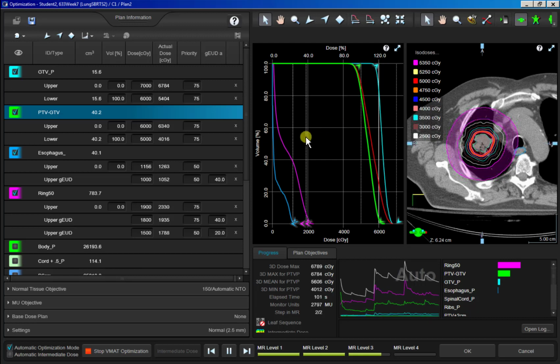Okay, so again, it just depends on the case. If you're not near any of your OARs like this, focus on that quick fall off, conformality. If you are next to OARs, failing objectives, overlapping with OARs, stuff like that, then you're going to treat that and optimize just like you normally would for any other plan.